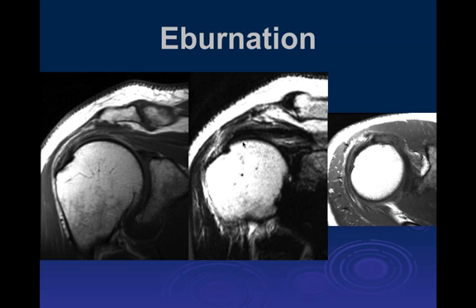In this particular case, distally on the T2 weighted image, we can see fraying and partial tearing of the acromial side surface of the supraspinatus tendon, which goes along with the impingement from the irregularity. And on the axial images, we can see abnormal increased signal intensity within the anterior distal portion of the tendon.